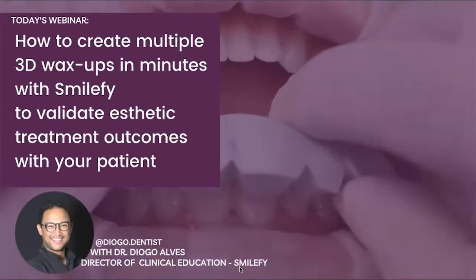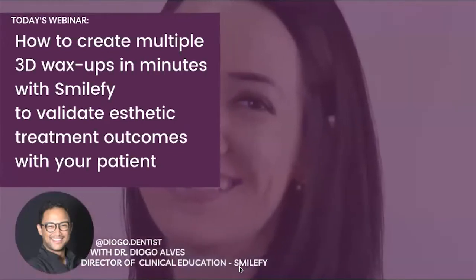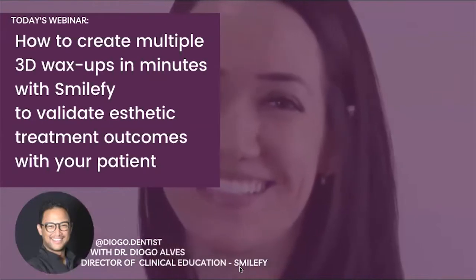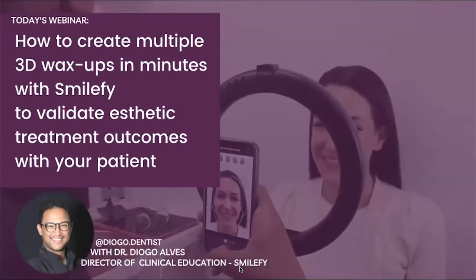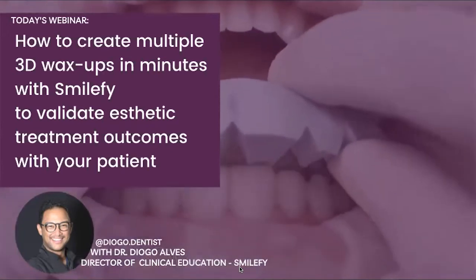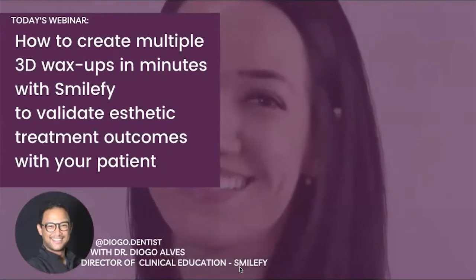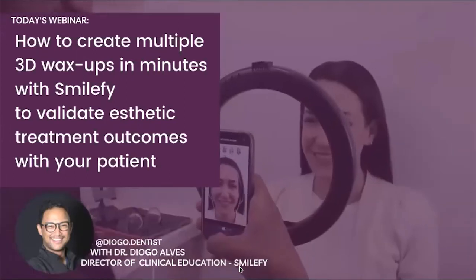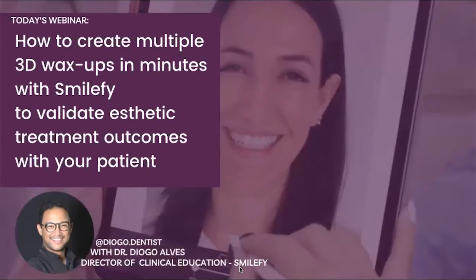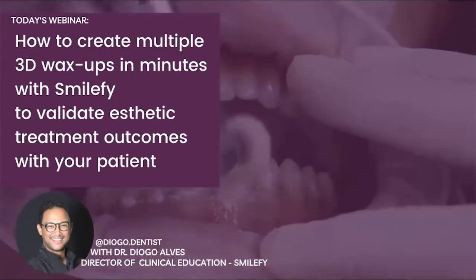And for the periodontists, we have this new feature called cross-section, which allows you to visualize the patient's bone and soft tissues and also do the measurements of it, which gives you a better idea on where to place, how much teeth exposure you want to perform for your periodontal procedure.